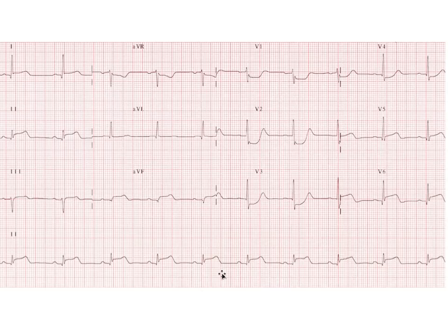Well, actually, this is a trick question. This is what we call a posterior infarct, and more than likely a posterior inferior. Why? Because remember, V1, V2, V3 are the anterior leads, on the front of the heart.